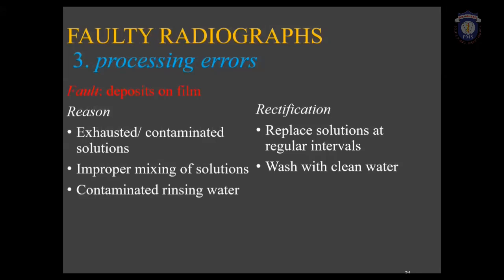Deposits on the film. This can also be due to exhausted or contaminated solution, improper mixing of solutions, or contaminated rinsing water as such. Adequate replenishment or replacement of the developing and fixing solution at regular intervals can avoid this. Ensure that you wash the film with clean water.